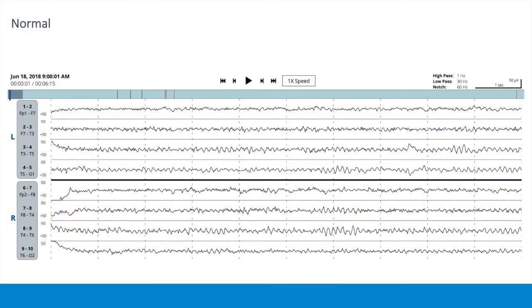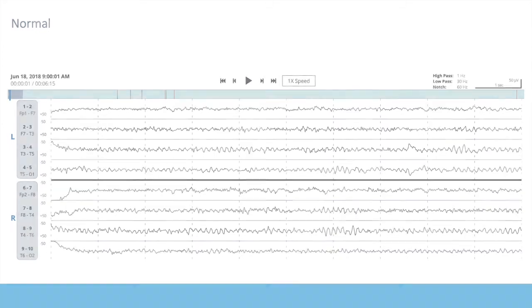We start with the normal condition. Why is this normal? Because as you will see, there is no departure from baseline. For the most part, all waveforms follow the same mean average, and you have healthy looking frequencies, especially in the occipital channels. You're appreciating a nice alpha rhythm.